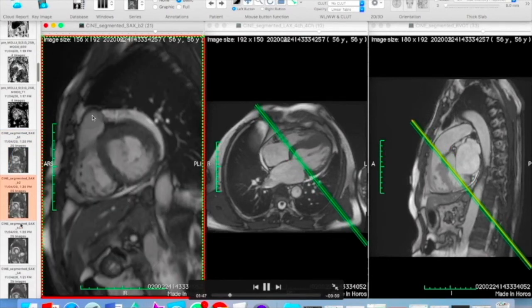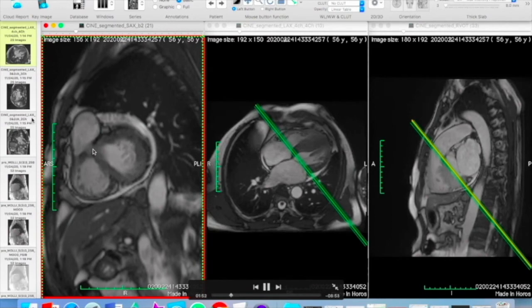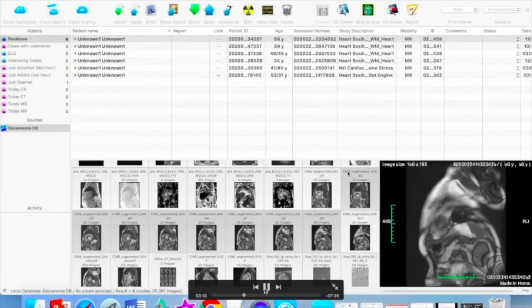So now in the next short axis cine, the entire area is made up of RV, so that will be included. It is important to remember that the most basal and most apical cine for LV and RV volumetry need not be the same, and this exercise is important to perform. Now we have identified the short axis cine for LV and RV volumetry. Select all these short axis cine in the panel.